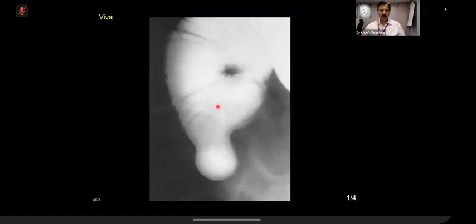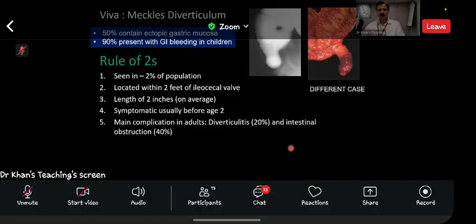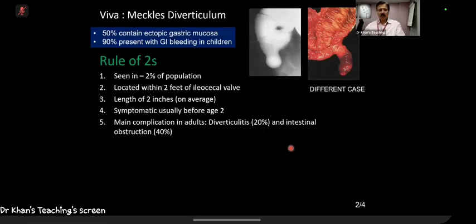Scleroderma. You see, this is the anti-mesenteric border. This is the ileum. This is correction. This is the anti-mesenteric border. This is the mesenteric. Right. And this outpouching is just maybe a small outpouching. And look at the mucosa. It gives you this V-shaped pattern here. The point is that this is a slam dunk case of what? You know it. Anti-mesenteric border, Meckel's diverticulum. Whatever is written here are potential viva questions which have been asked in the exam.